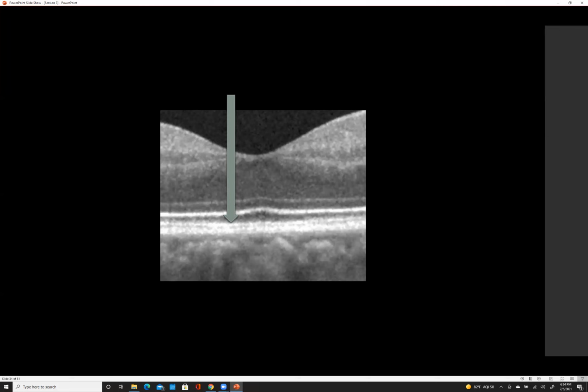No. The Mueller cell's up top, right? Up top, yeah. So here's your Mueller cell. Its feet are here and it comes all the way down and its head is here. So the Mueller cell is nowhere here. This is the RPE, right? So the RPE creates its fingers. So the apical processes of the RPE are interdigitating with the outer segments of the photoreceptors. Make sense? Yep.